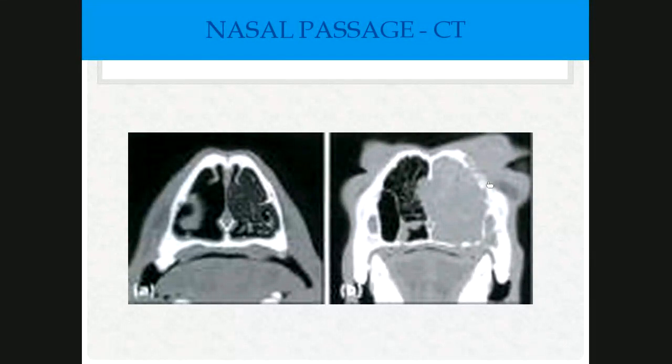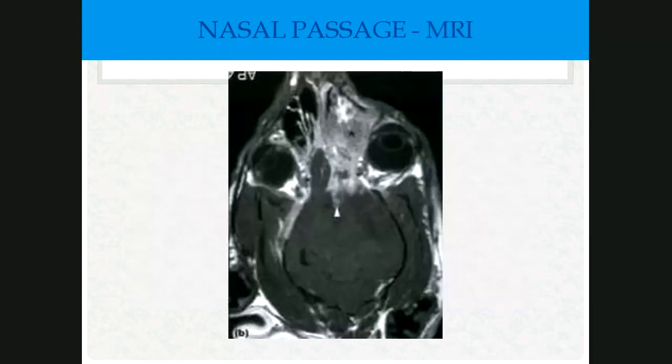In rhinitis, CT will normally show variable degrees of nasal exudate accumulation and turbinate loss. It tends to be more multifocal and is more marked rostrally in the nasal cavity. CT is also very useful for detecting fluid in the frontal sinuses. And then just lastly, MRI can also be used. It's better for soft tissue.